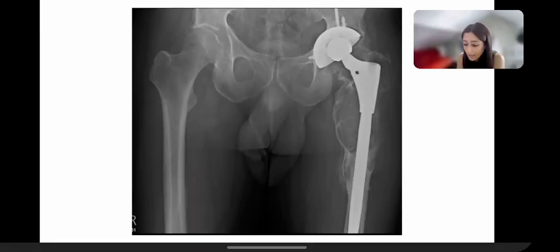Now, we have our surgeons, really experts in doing revision hips and knees, so we see a lot of this. Patient had a complex left hip replacement, presented with pain and swelling. And on the plain radiograph, you can appreciate this really large, expansile, multiloculated, multiseptated lesion.